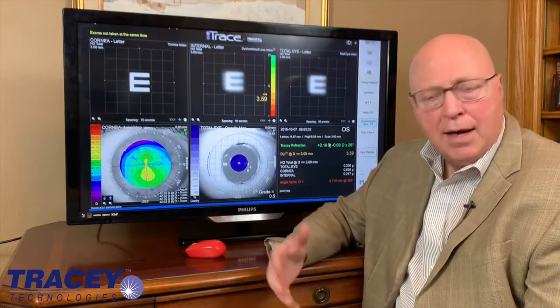And a lot of people say, well, it's easy to know. Well, not always. Sometimes the capsule doesn't look all that opacified, but when it fibroses, it does something to the lens. And when you release the tension on the bag, their vision will improve. So for what it's worth, I thought it was an interesting case and wanted to share that with you. Hopefully Dr. Jane's study will be out soon showing that the opacity grade actually indicates to her the appropriate time to do a YAG capsulotomy.